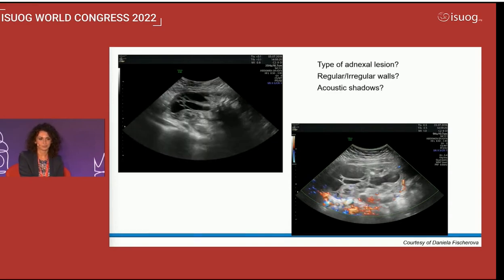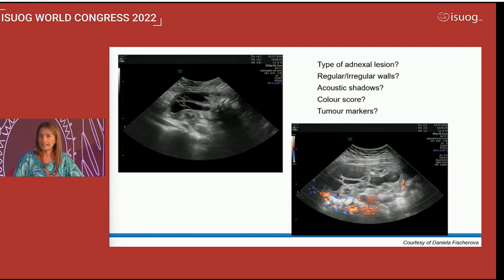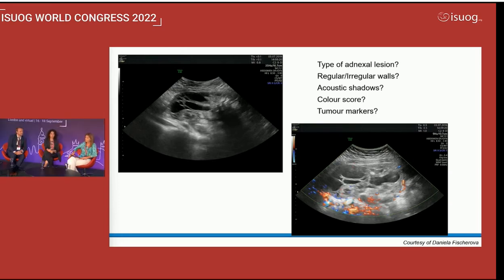What's really reassuring is that there is no possibility of confusion between dermoid and immature teratomas. Even if perhaps there could be some cases, but usually they are typically immature teratomas. So you won't be in doubt with the benign. But one case was tricky. It was more cystic, and it was tricky. Just wondering, do you ever see hair, like the lines and the dots?